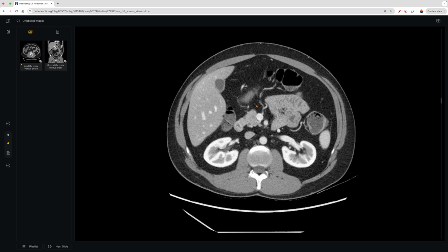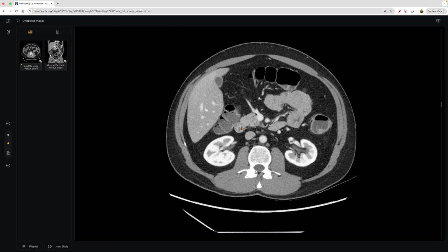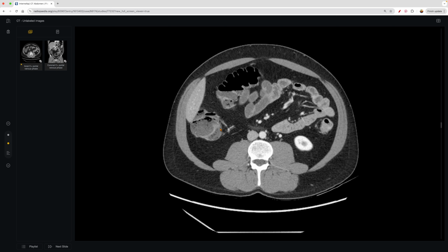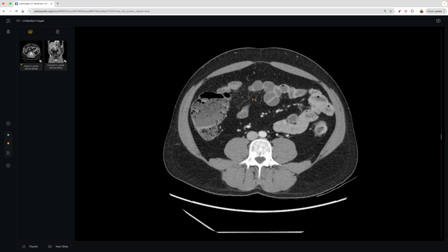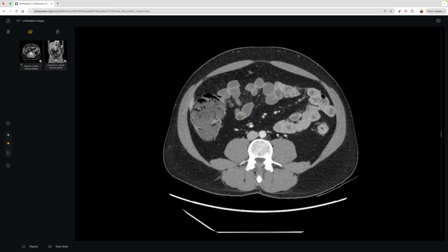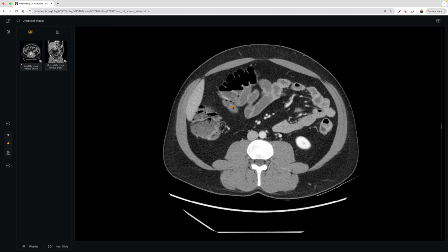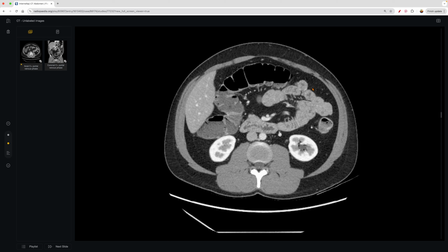And then you can trace the bowel, and you'd have to go kind of up and down, superior, inferior, scroll around. It can be dizzying on the video, but on your own time, feel free to do that and see if you can trace the bowel, just to get familiar with the anatomy. See the mesentery, the small bowel, and we know it's small bowel as well, just given the caliber of the intestines here.